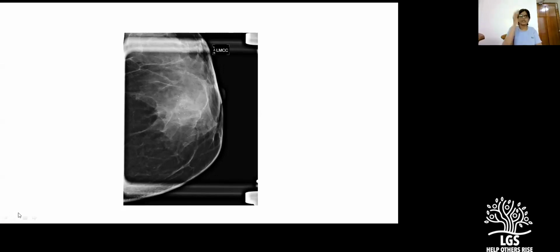Magnification is always done on a 2D image. So even if you spot calcifications on tomo, you go back and do a standard 2D. I have started using HD tomo, so then I get synthesized 2D images. I do not do a routine 2D image. I only do a tomo and then use a synthesized 2D image.